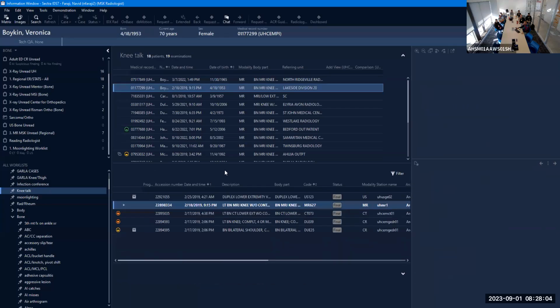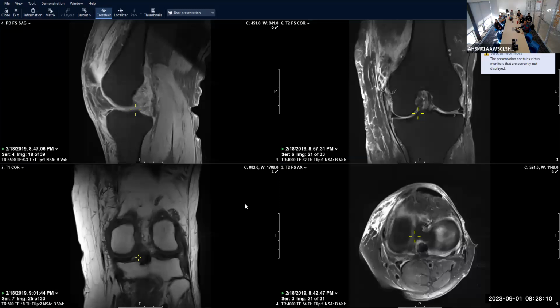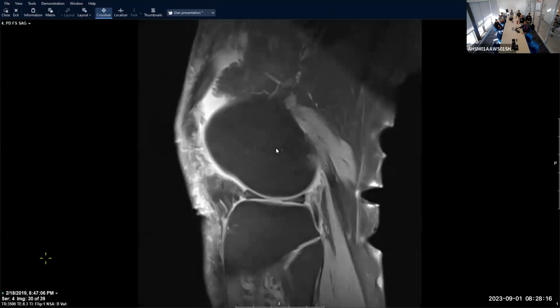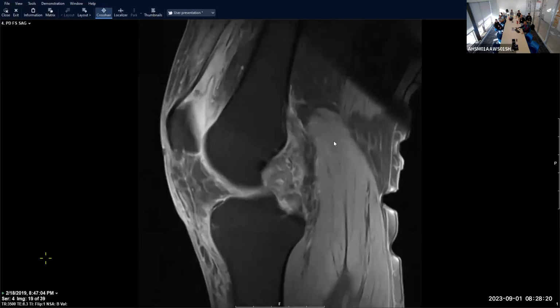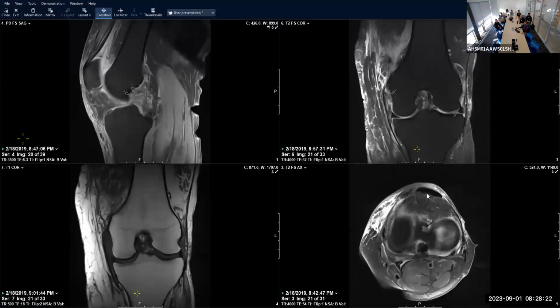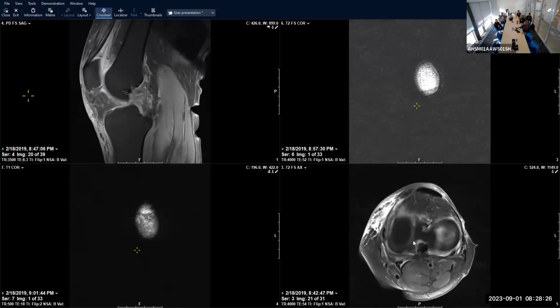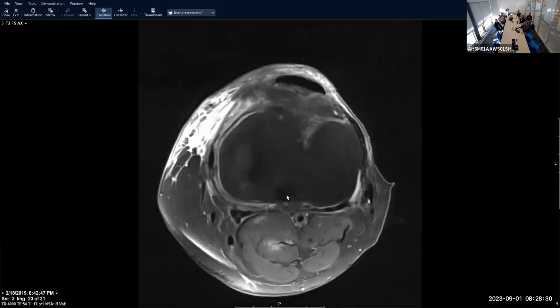Okay, let's try this one. Patient. It's a bad name when it's patient. Okay, so search pattern. Let's see. Okay, so I'll give you a couple images here. You have a positive arrow sign. But let's see. So I'll leave you with this: follow this thing.